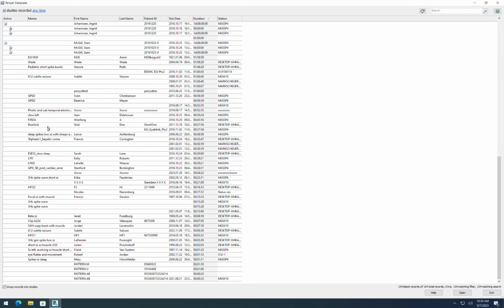And just thought I'd show one of the features that can be handy in P14 revision D or later. All these instructions apply to Rev.D or later. That includes D1, D2, D3, and so on. P15, however, will have an even more streamlined approach to generating intracranial trends and detection. So with that said, let's go ahead and get started.